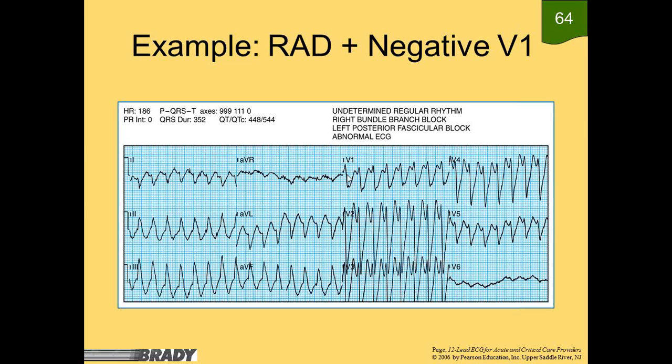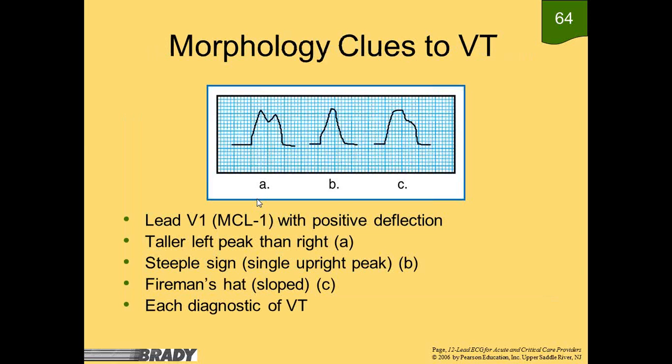And this gets really difficult because it's like, what's up and what's down? Where's the top and where's the bottom? But you can see you probably have a coming up into your ST, QRS down. Here's your J point. So we're going to call this up. And you're going to see here it's calling it a right bundle branch block, left posterior fascicular block. And there's probably definitely some blocks there.